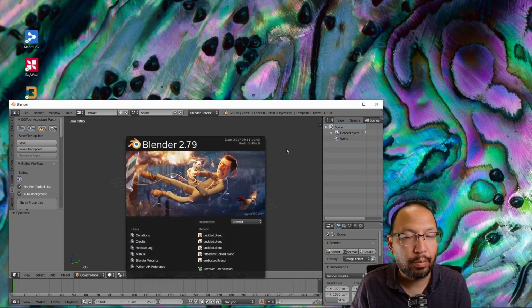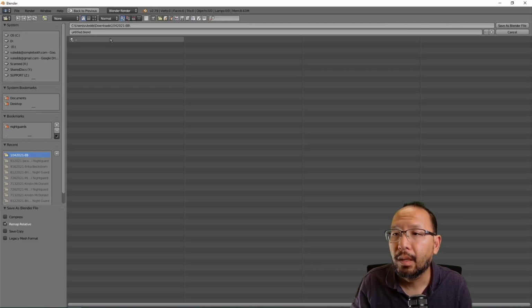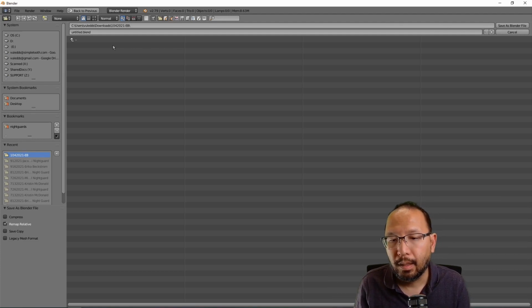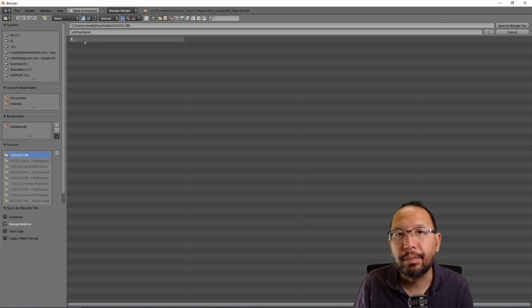We're going to close this user preferences box and maximize Blender. It'll make your life a lot easier. I'm going to hit save to start a Blender file. Blender is the 3D CAD animation program, like a 3D Swiss Army knife. But the people at D3 Tool, that would be Kevin Yoder and Patrick Ryan Moore, have created a really ingenious wizard script that works on top of Blender to make a night guard very easily and very affordably.